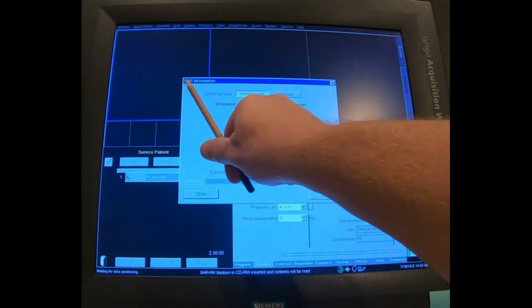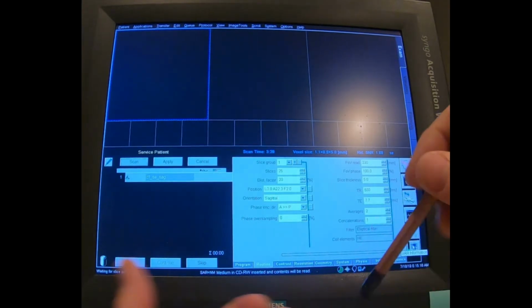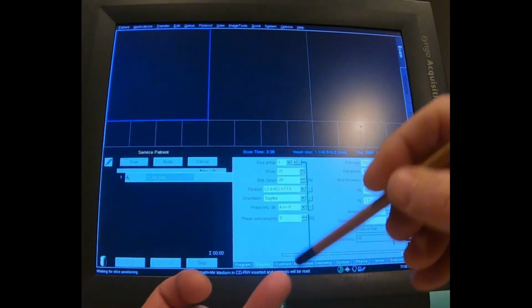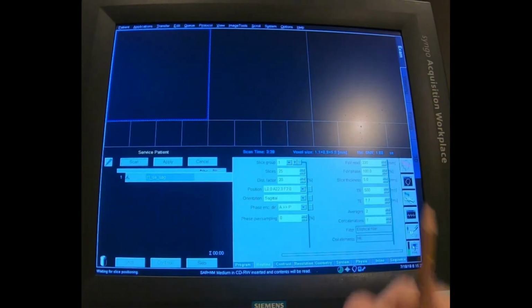Okay, so what's SAR? PALI, power absorption limiter, measures runtime SAR. What is runtime SAR? Well, there's two types: look ahead, and then runtime. If I look down here at my SAR calculation box, what is SAR? SAR is specific absorption rate. Specific to what? Specific to the patient. So weight, age, male or female, that type of thing.